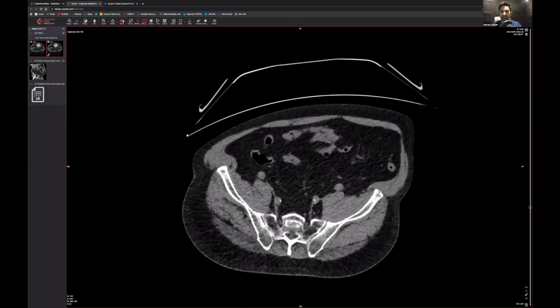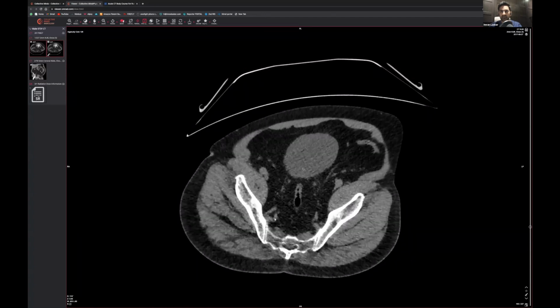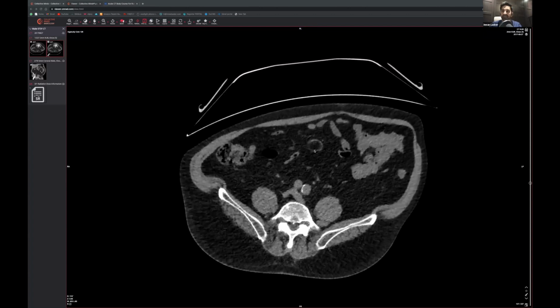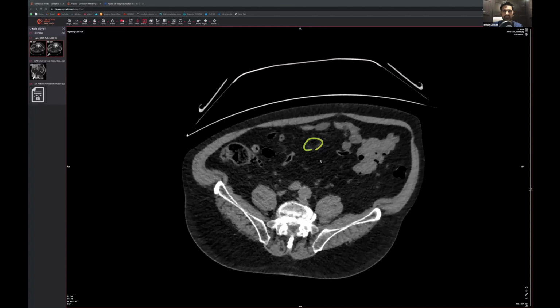So a few people have given the answers. Let's come up this way. And someone has spotted, and maybe they've seen this case before, I don't know, but we can see. Can you see that circular thing there? See that? Well done. So then you can see there's a circle there, can't you, right? That doesn't look usual.